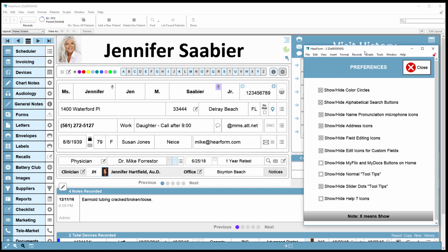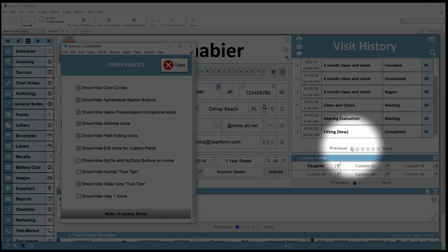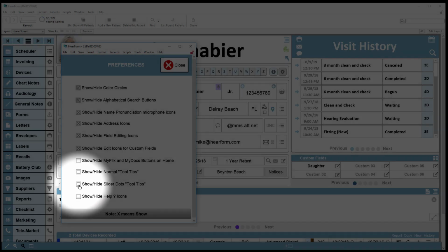And in the same way, let's look at some of those dots. Right here, when I hold the mouse over here, a message will pop up off to the side of the dot, and so I can hide or show those by clicking this button here.